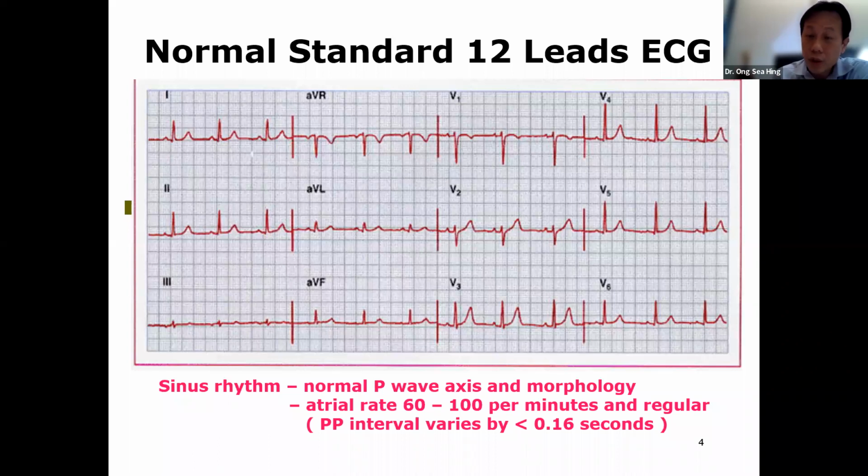Just an example, if you have a patient with ventricular tachycardia or VT, and the electricity comes from the apex of the heart, then you will see that these spikes will be negative in their deflection because the electricity will be moving from the apex upwards, and therefore the deflection in these 3 leads will be negative, which is what we also call a superior axis. So it's just to have an understanding that when the electricity is moving towards the lead, it will be positive. When it moves away from the lead, it will be negative. Okay.